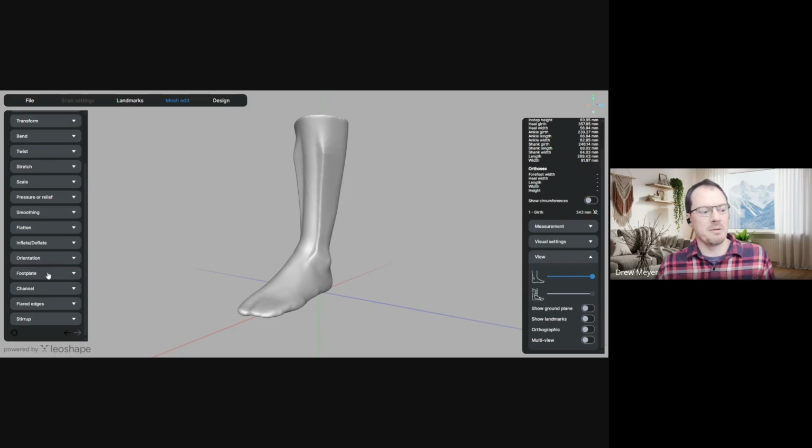And then you can open up your next tool and start doing some work. If you rush it and you close that tab before it actually runs the calculation, you might just lose your work if you are rushing the program. So I want you to just wait a second there and it will apply it and you can move on. Okay, so that's the channel tool.